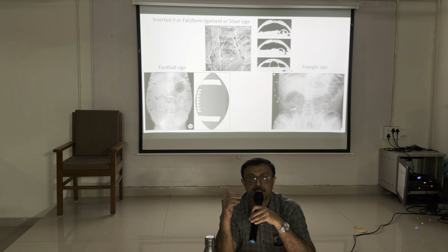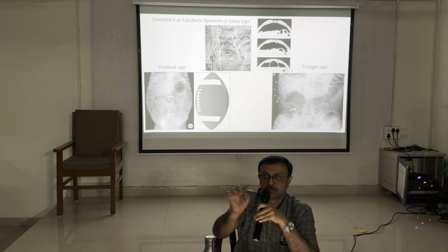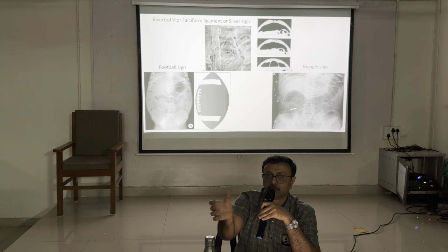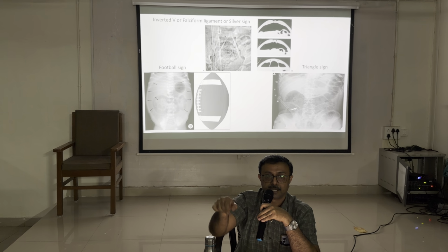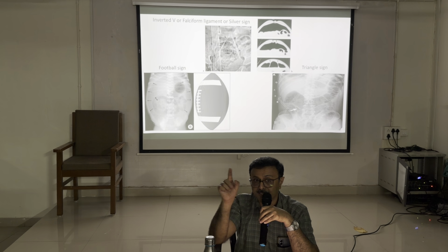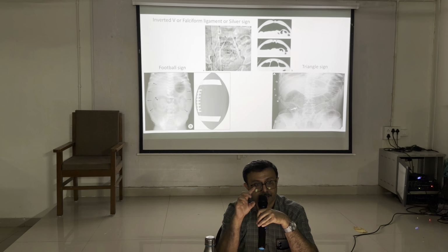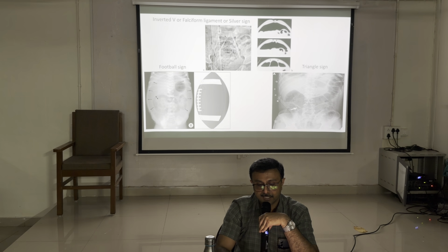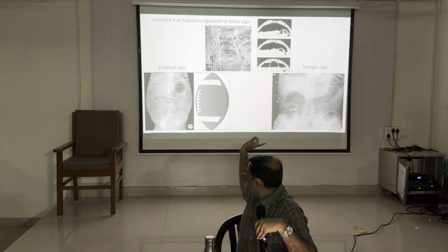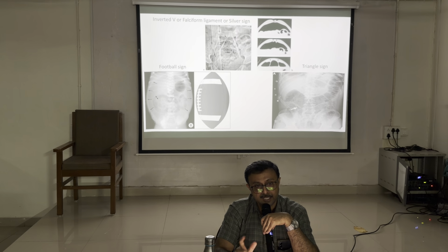Imagine a bowel loop. One bowel loop is there. If we take two bowel loops, the area between them will become a triangle. Mesenteric area. Gas is entrapped there. So now it is triangle sign. Gas is entrapped in the loop of the bowel, showing a beautiful triangle sign. That can be the site of perforation.